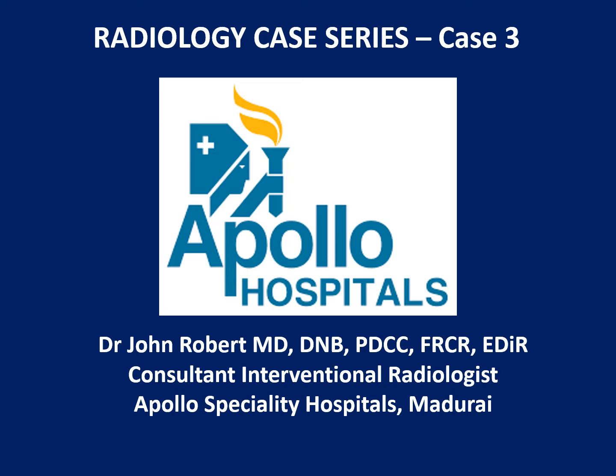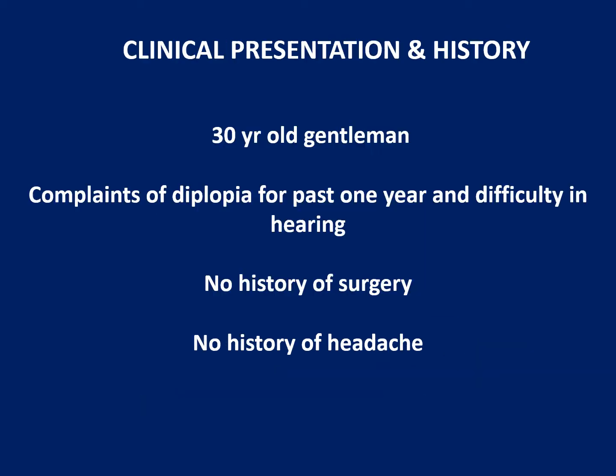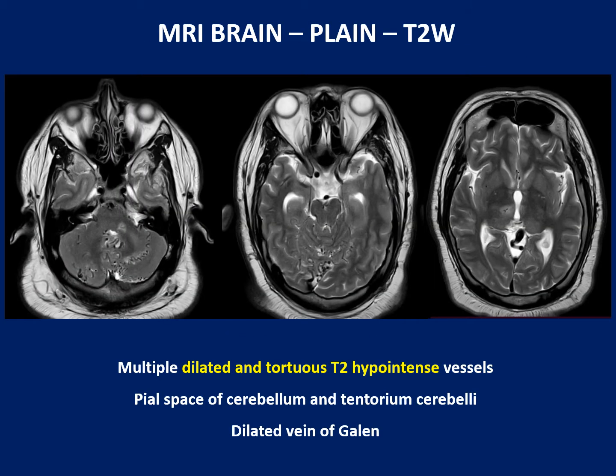Hi everyone, today I'll be presenting a 30-year-old gentleman who came with complaints of diplopia and difficulty in hearing for the last 1 year. There was no history of surgery or headache in this patient. These are the MRI brain images.